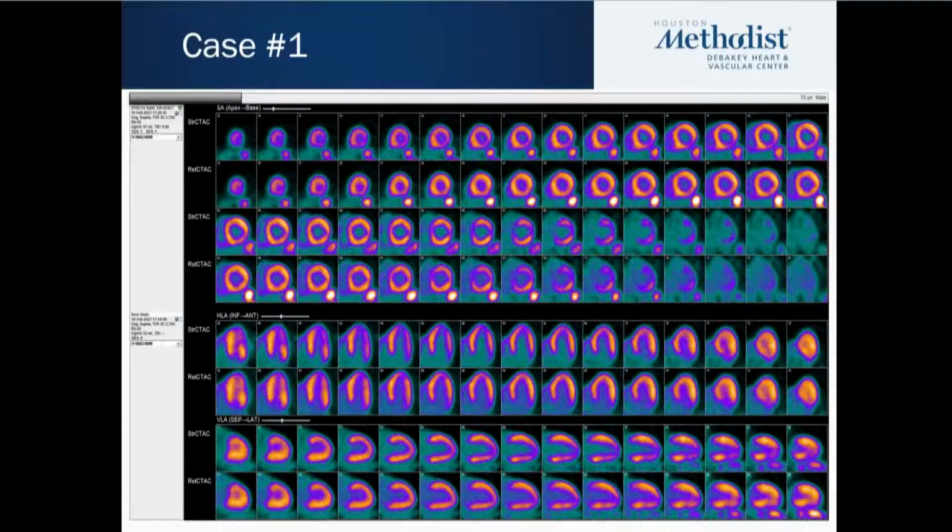Because you can see there's a small perfusion defect maybe in the apical and mid-inferolateral, right? But everything else, like the mid and basal anterior wall, the inferior wall, the apex, looks to be okay. If this was the only information I had, I would probably call this one vessel CAD, OM, circumflex territory.